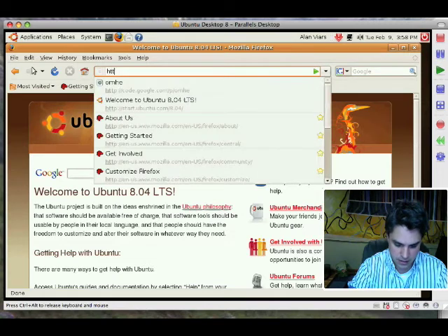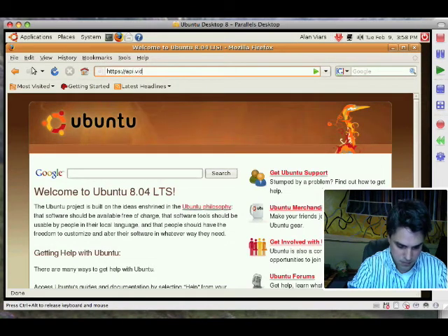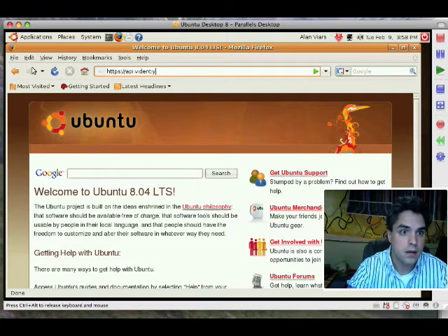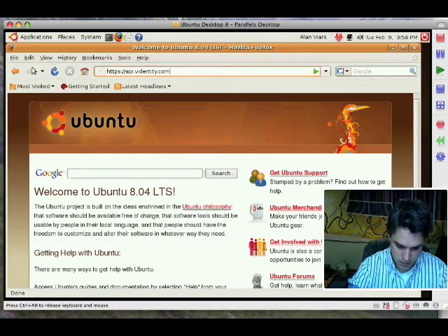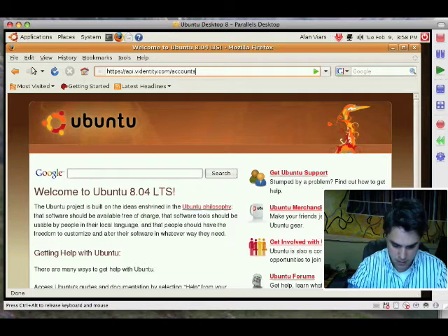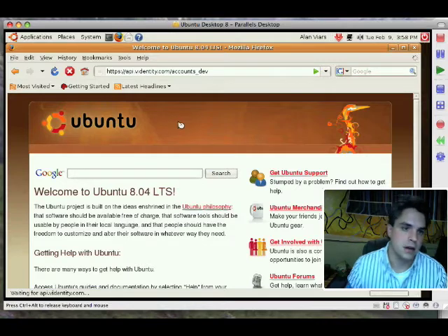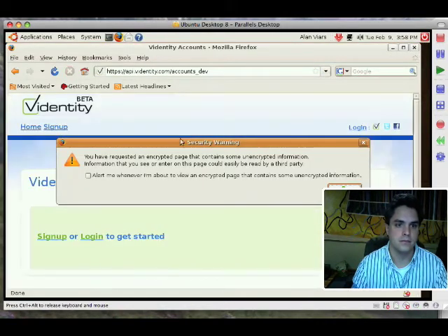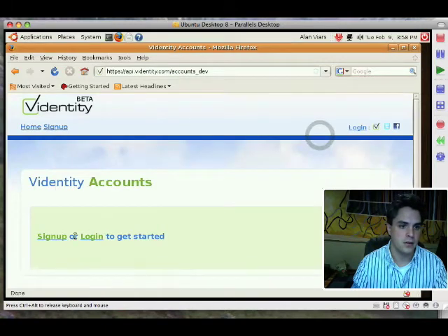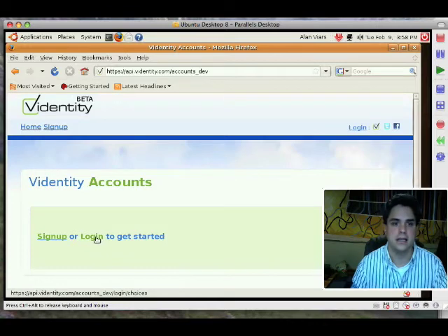Okay, so now I'm going to show you that data being read. It can take a few minutes, or maybe up to a minute and a half, to actually end up in the system.